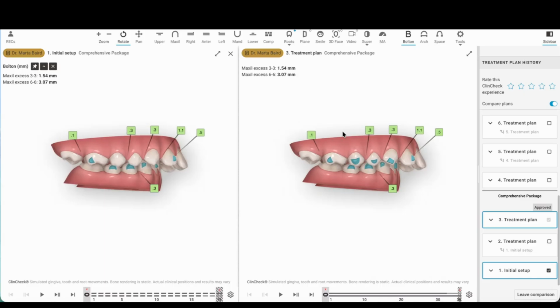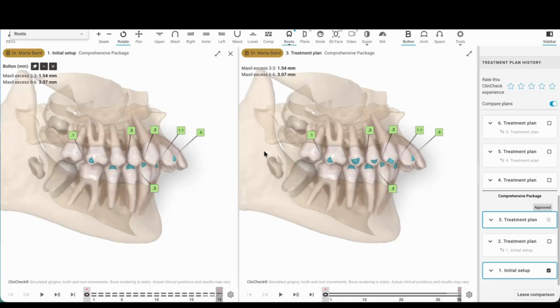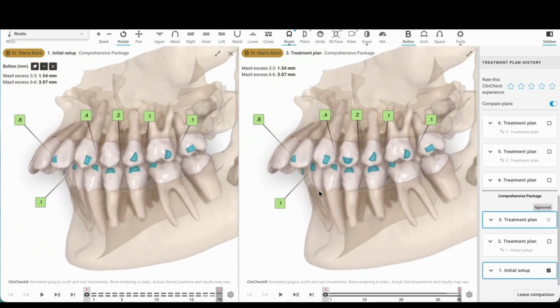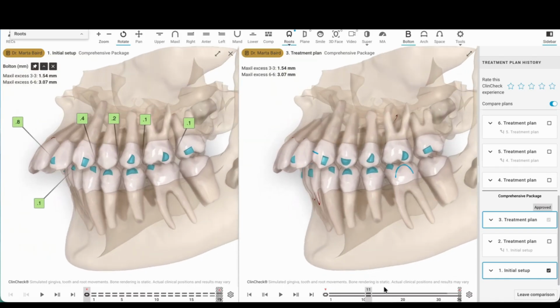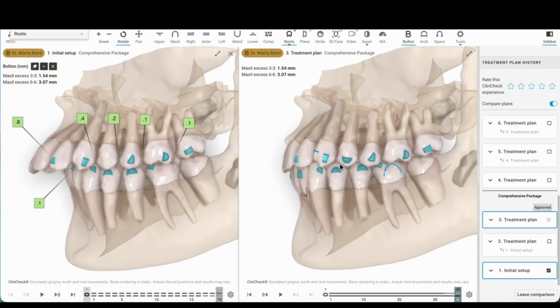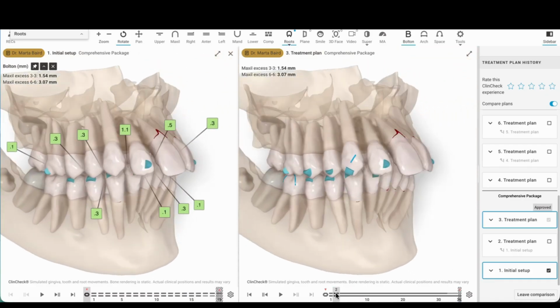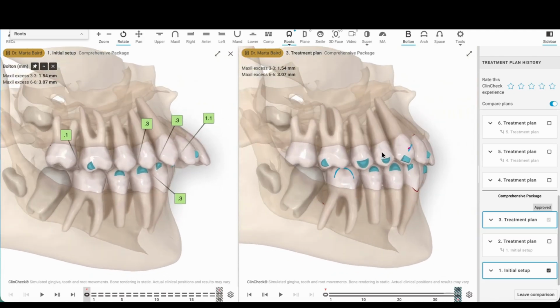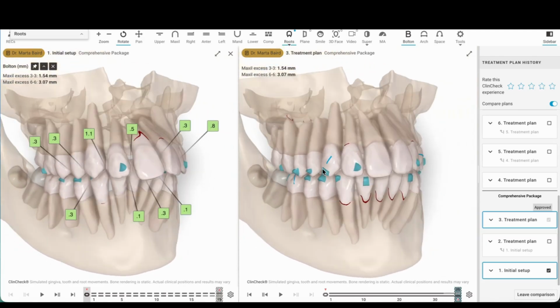And one of the benefits of CBCT integration is that you can really see where the spaces are interproximally when someone has partially erupted teeth, when the gingiva is in the way, and you want to avoid root collisions or collisions as you're trying to align a rotated canine, when you want to avoid overclosure. So having that CBCT data is really helpful.